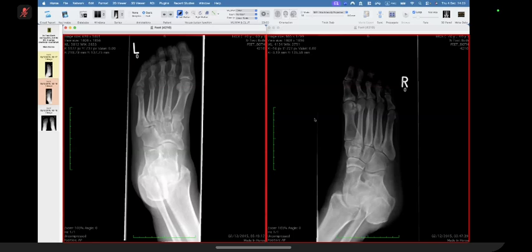Yes or no? It may or may not. I'm just taking a moment to have a look at the images, sir. I do not find anything additional. Actually, now I can see that the joint space, whichever was appearing reduced, is similar, but I'm not able to clearly appreciate the subchondral cystic changes, which I was mentioning previously. But the other visualized bones are also appearing grossly normal.